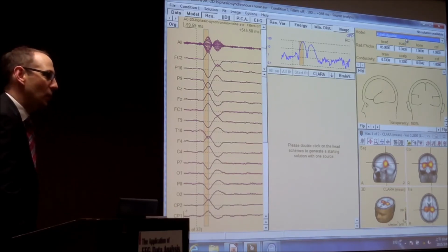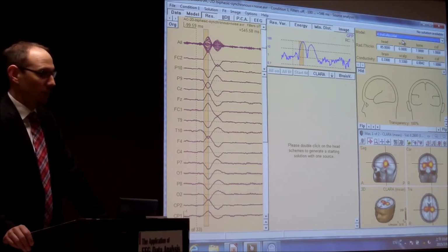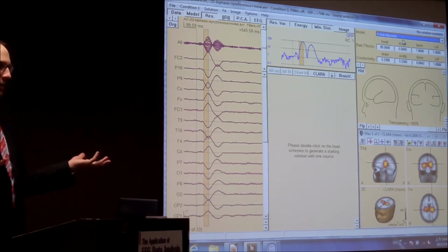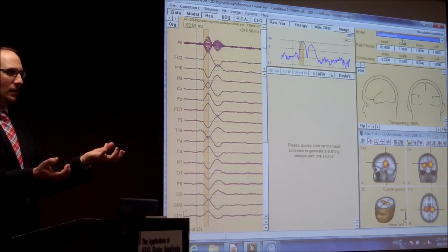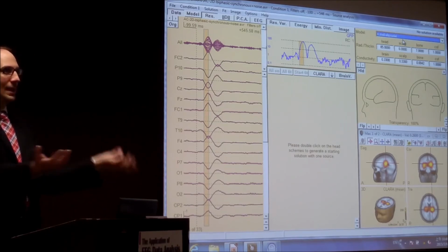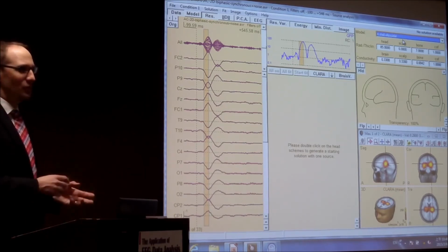So if you have the MRI available and you say BESA, there is the individual anatomy available, we do the localization directly in the individual anatomy. That's for the co-registration with our data set. So why is co-registration interesting? Just imagine an apple on the one hand and an apricot on the other hand. If you just look at the shape, they do not look too different, in fact, but the size may really differ. So now I localize something in my apple, because that's my standard brain, but I have a smaller brain because it's a child or something like this, because it's the apricot, I make a big mistake. I cannot transform this one to one into the other. That's impossible. So then, if you have to make a decision, especially if it comes to epilepsy surgery or something like this, it would be absolutely fatal not using the individual anatomy.